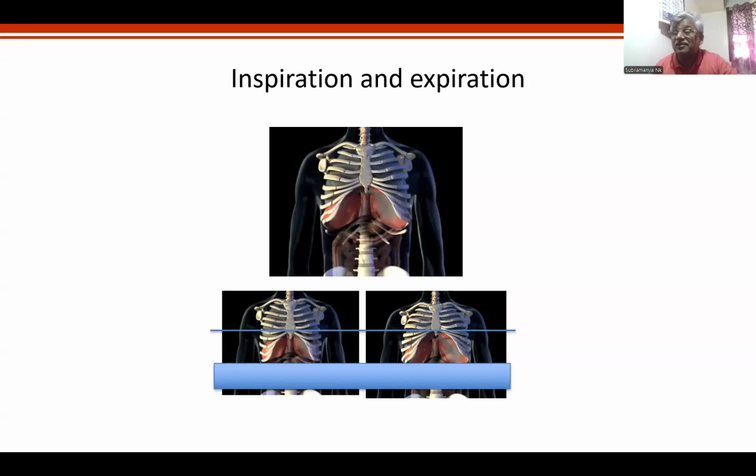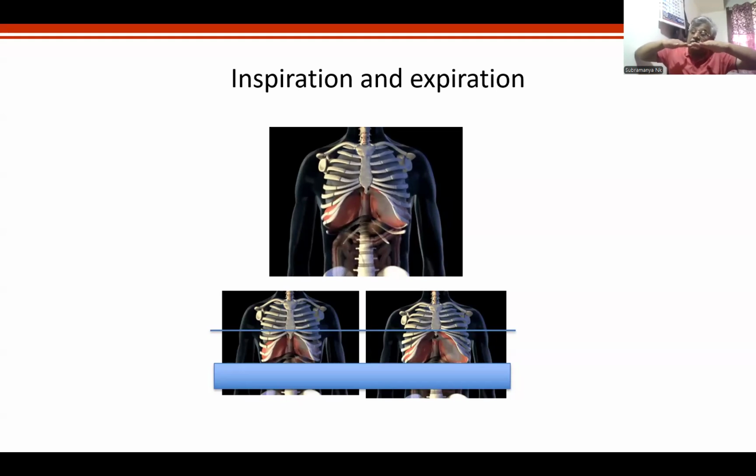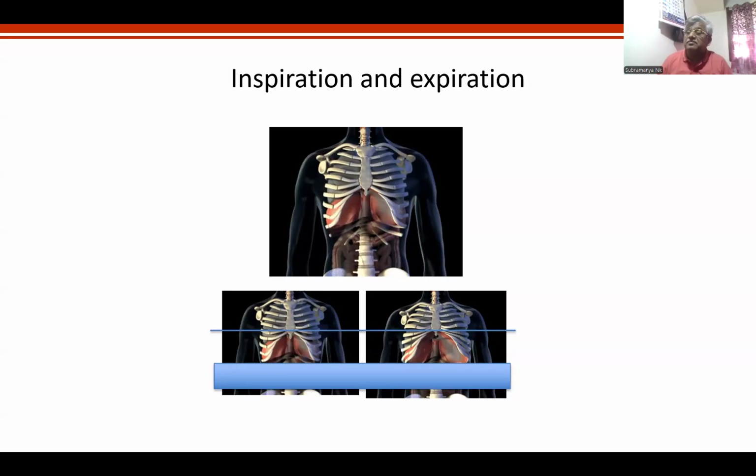We start from the clavicle, upper lobes. Hardly anything is there except the thymus. And whatever we pick up, we are behind that. But real problems happen in the lower half. And a large amount of the lower half is hidden, hidden behind the diaphragms. It is beneath the heart.